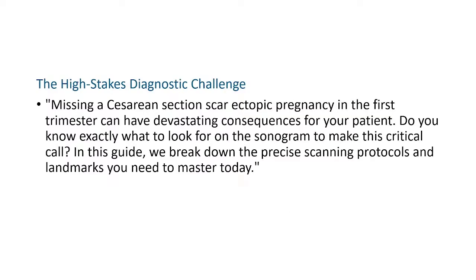So the high stakes diagnostic challenge in the first trimester ultrasound scan is missing a cesarean scar ectopic pregnancy. That can have devastating consequences for your patient. I think nobody wants to miss that, from the professional standpoint.